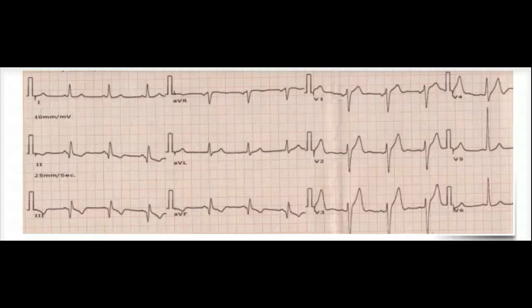Okay, again, let's look at another ECG. Do we see any Q wave here? By the way, what are these? These definitely look like Q waves, right? But they're not. Why are these not Q waves? Because what did I say? Q wave was the first negative deflection.